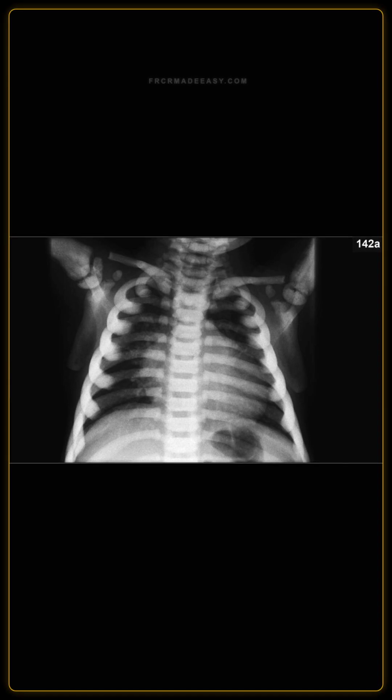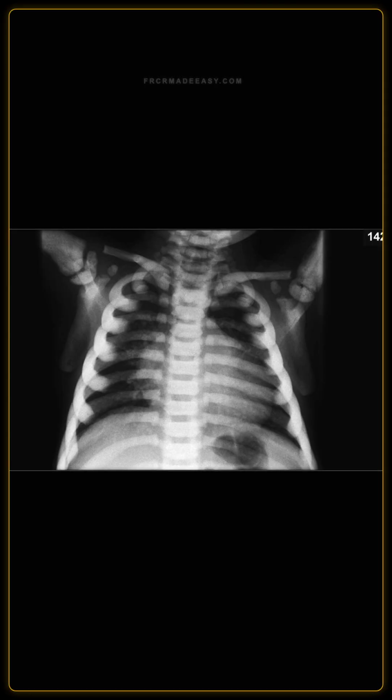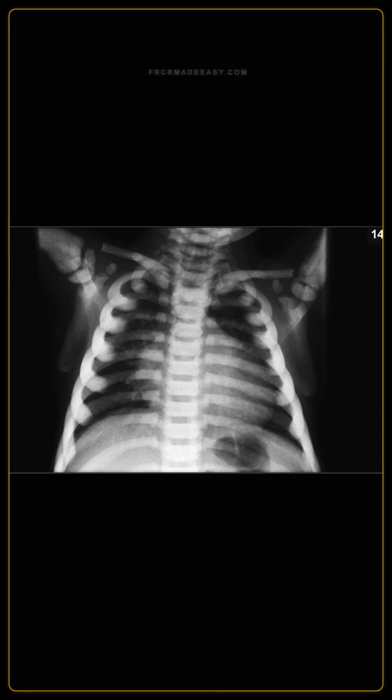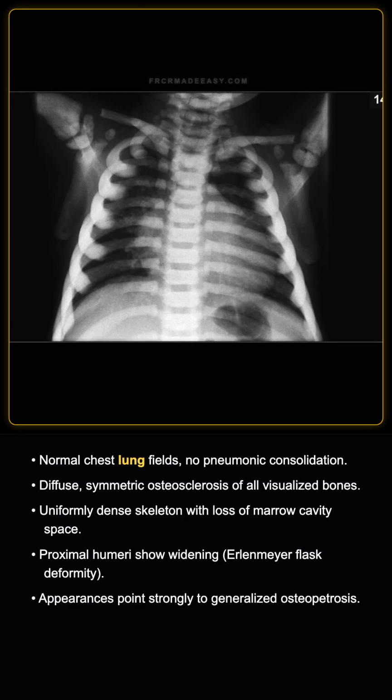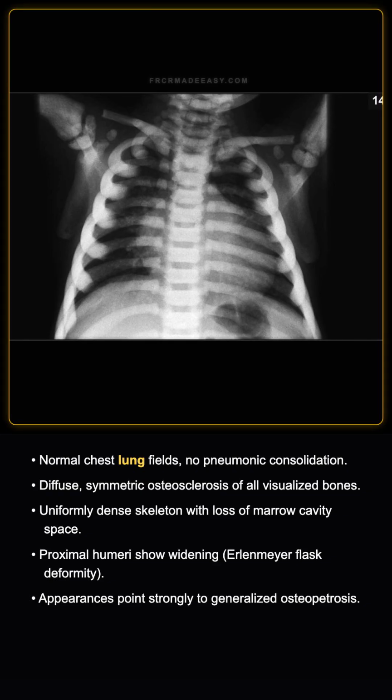A 4-year-old boy presents with a suspected chest infection. I am showing you the chest radiograph. Describe the findings. Let me just study this for a second. Right. The chest radiograph demonstrates normal lungs and pleural spaces with no evidence of active pneumonia or effusion.